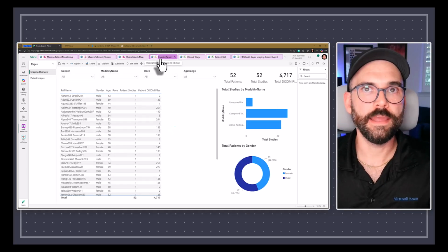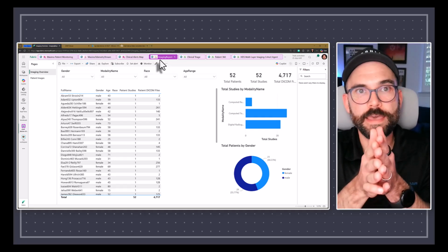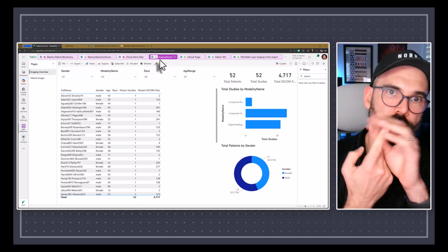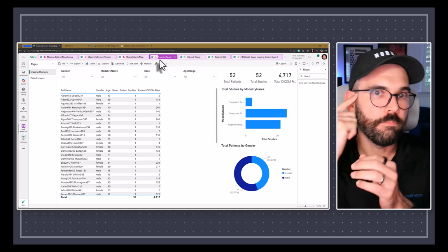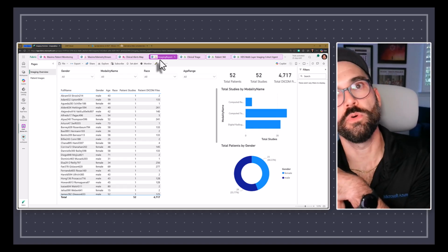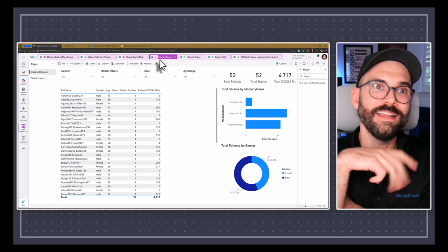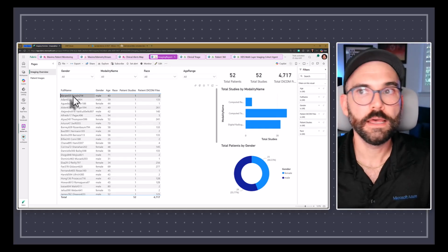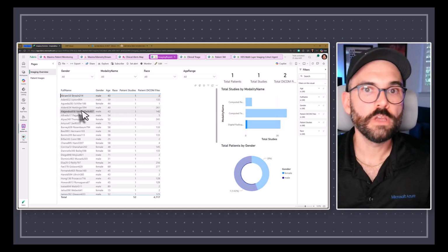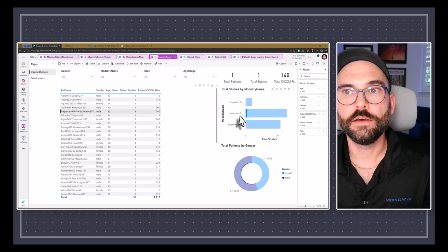Then I can take a look at, remember, we're taking DICOM images or X-rays and MRIs and things like that, and tying it to those folks that have our little finger monitors for pulse oxygen and things like that. And maybe I want to tie in, oh, I'm getting alerts. Maybe I should go look at a chest X-ray for any of those folks that are having problems with a high pulse or low blood oxygen levels. And say, well, you know, this Abraham Strossen, he has a digital rad image. And then for Alejandro Valdez, I have CTs.